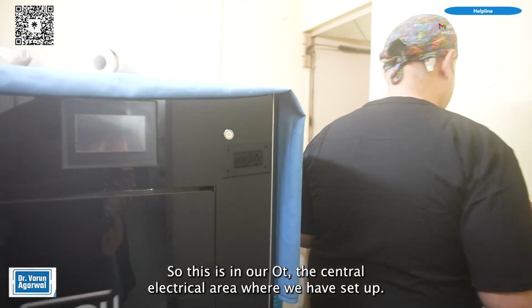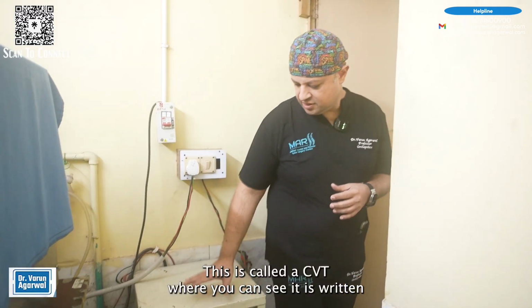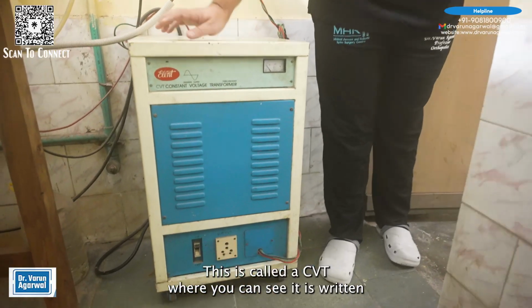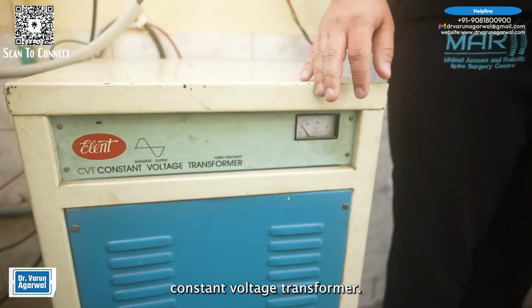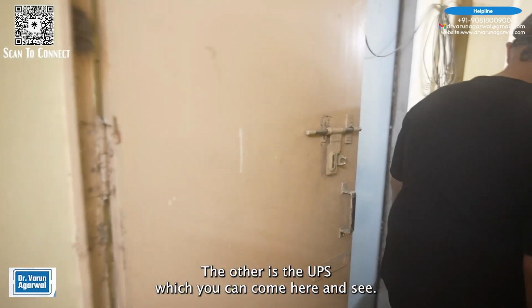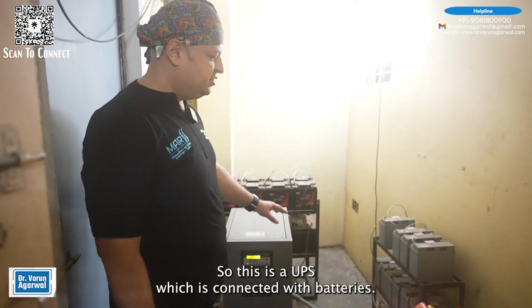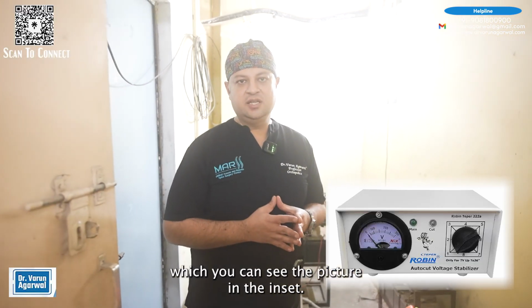So this is in our OT, the central electrical area where we have set up. This is called a CVT, where you can see it is written constant voltage transformer. The other is a UPS, which you can come here and see. So this is a UPS which is connected with batteries. The third thing is called a stabilizer, which you can see the picture in the inset.